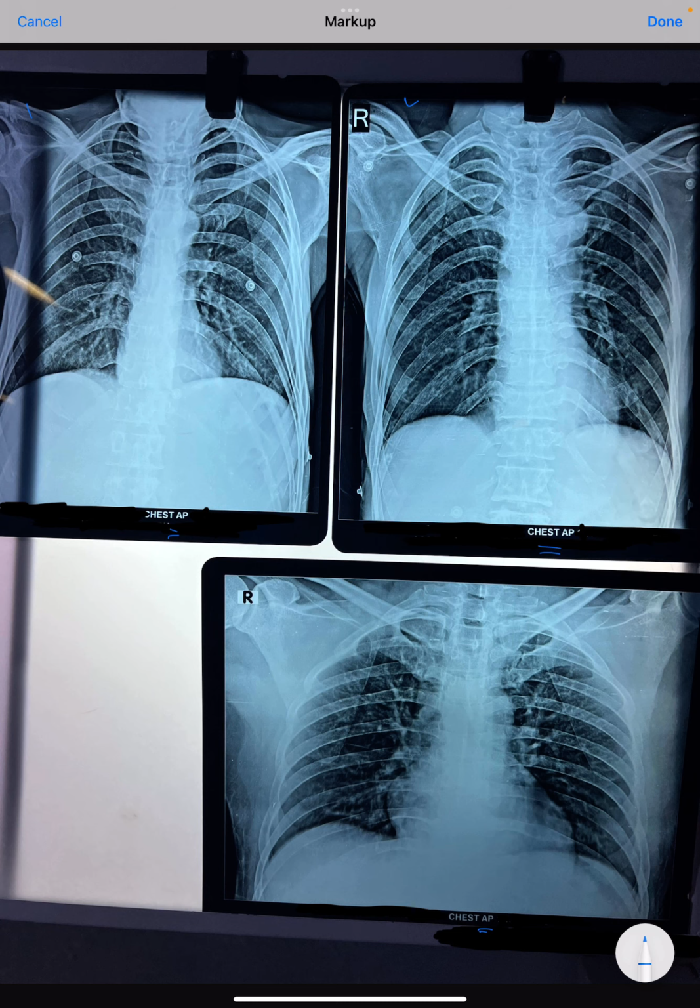Now, when we see this one and two, the first and second X-ray, they are from different patients. These are not of the same patient. These are two different patients, and this is a totally different, third patient. What we can notice is that this vertical distance looks so much larger in both of these X-rays, and much lesser in this X-ray.